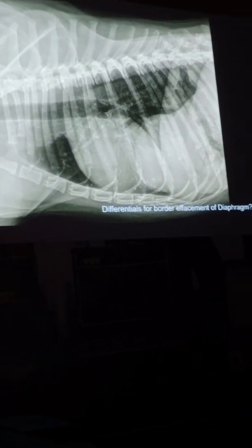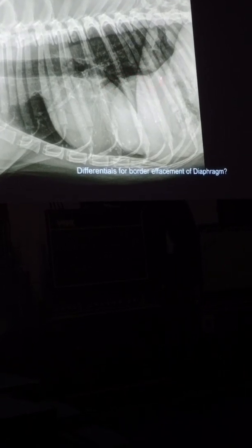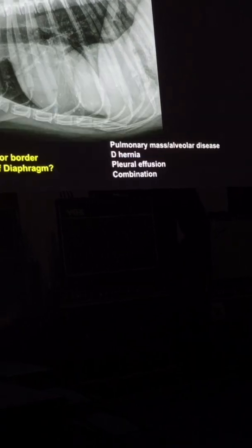Look at this right here. La carina. Look at the diaphragm and look at what happens here. That's the extrapleural sign. Remember, if it's a lung mass, the mass should probably come around this way, and we get an acute angle, but this is an obtuse angle.